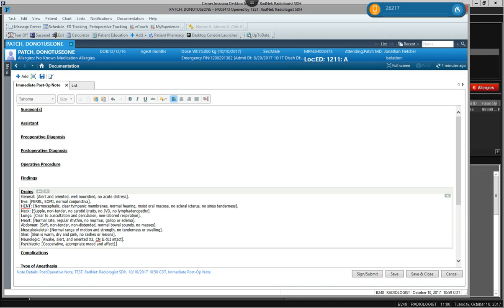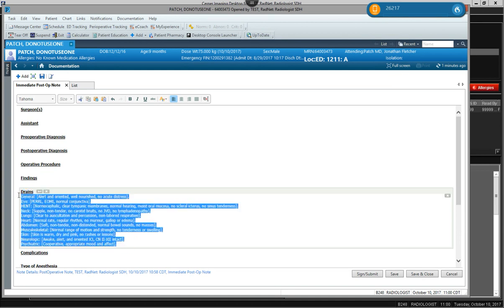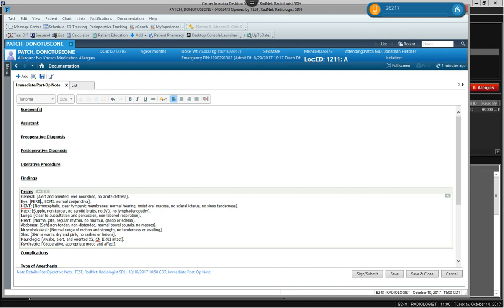So that's one that's already built into Cerner and can be useful if you are doing a brief admit note. Delete that. But before I do delete that, notice that common element of Cerner templates is that they include the brackets. The brackets are considered a field that can be used in Dragon for easy scrolling using your speech mic.